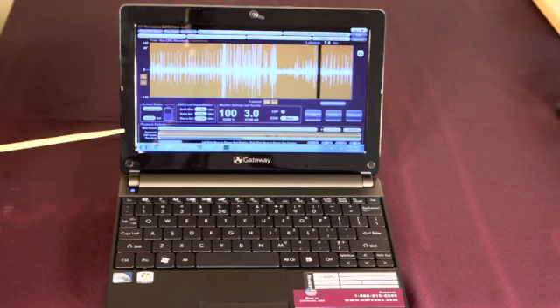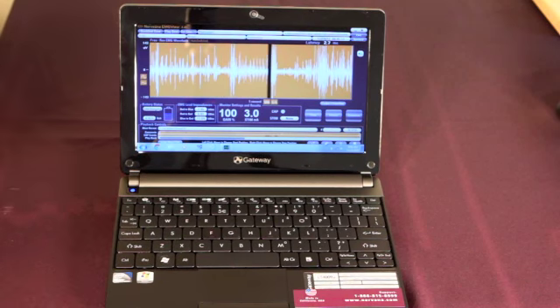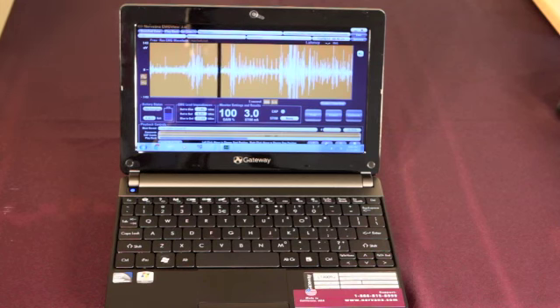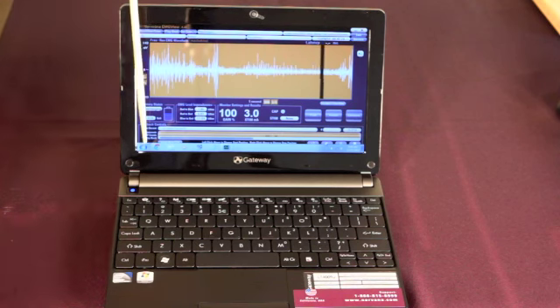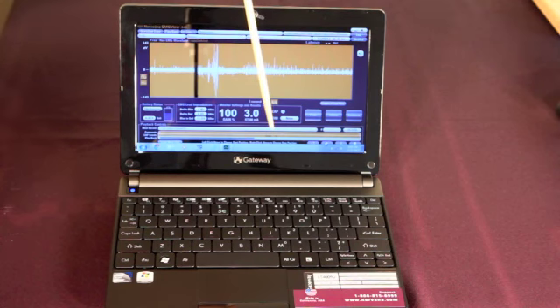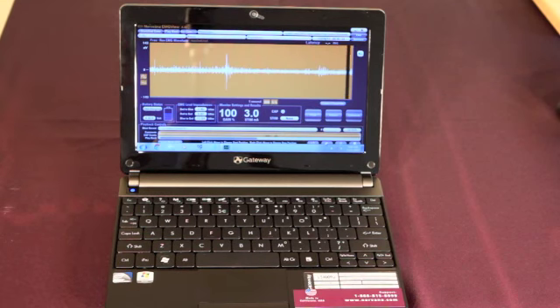The last horizontal bar to mention is the third one down, and it's labeled Cap Events. And what that will tell you is where a significant event or an alarm event from the Nirvana occurred. Typically at the beginning of the case, when the surgeon is first approaching the nerve, there isn't much significant data. And so it's handy to be able to look along here and see that a series of significant cap events were grouped together, and that tells you that's probably the part of the surgery that's the most relevant to be reviewed.